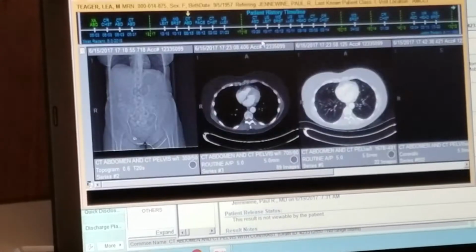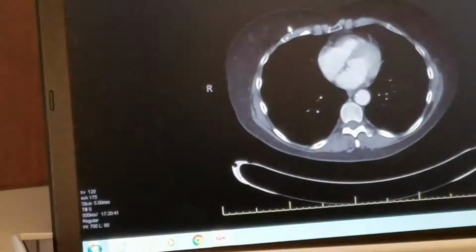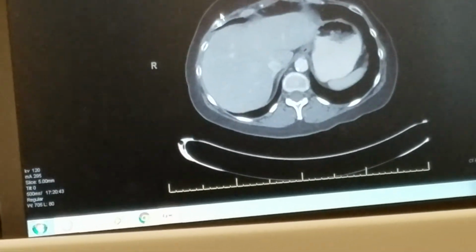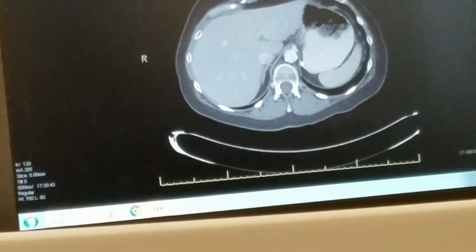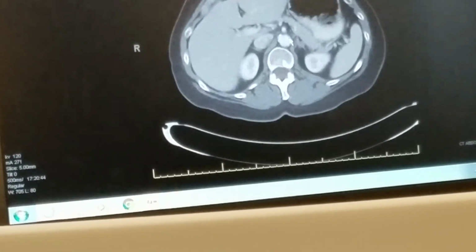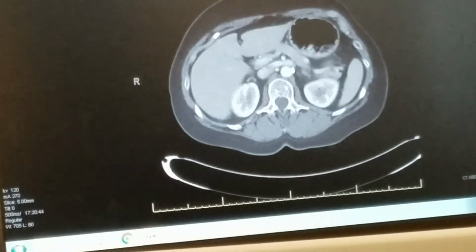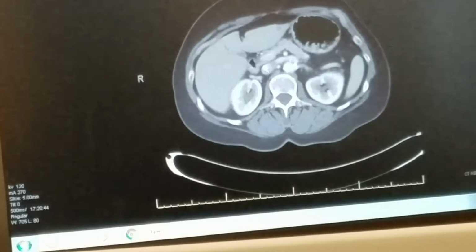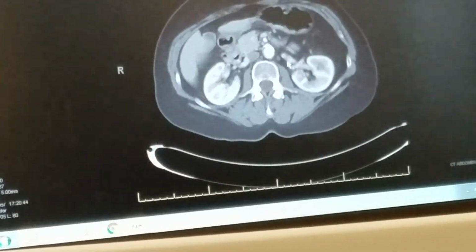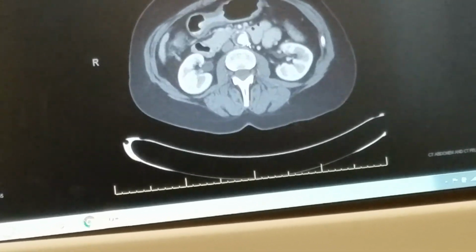So this is the one from 2017. Yeah. And we're looking at cross-sectional images. There's the aorta, this little circle here. There's the branches. These are all arterial branches coming off of the aorta. There's the renal vein and the kidneys here. Here's the liver. There's the stomach. And just below the kidney arteries, you can see the white stuff. That's all the calcium that's in our system.